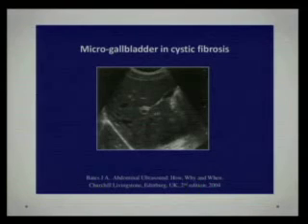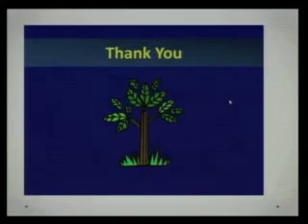This is just a patient who had cystic fibrosis. The gallbladder is chronically thickened and is not responding to fasting stimulus.